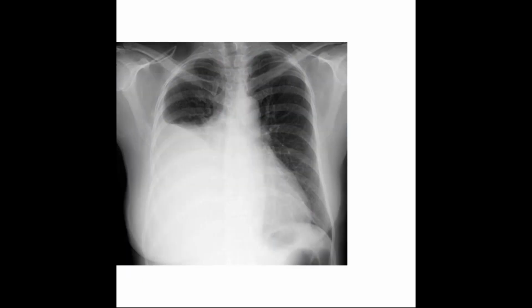So we come on to this. This is a fairly easy X-ray. I'm sorry that it is there on the slide quite late, but it's a very common X-ray asked from you guys. Airway, fine. Airway is fine.